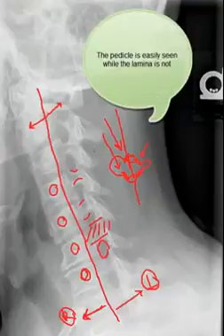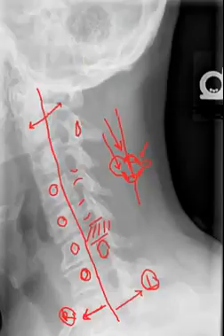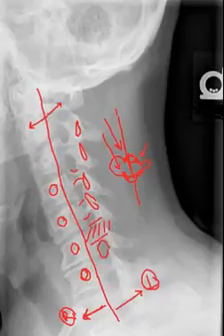The other lamina we are looking down the length of, and so you get this very rounded appearance, in this case the left lamina, superimposed over the articular pillar. This can be a little difficult to start, so don't be confused. Just remember that when you make this division, left and rights are respected with the exception of the lamina, in which case both lamina will be visualized on the same side as the IVFs you see.